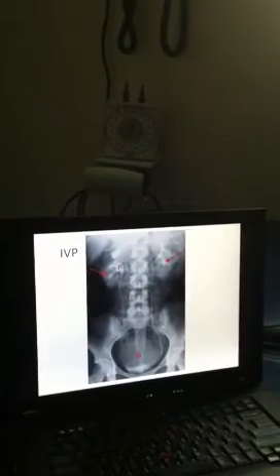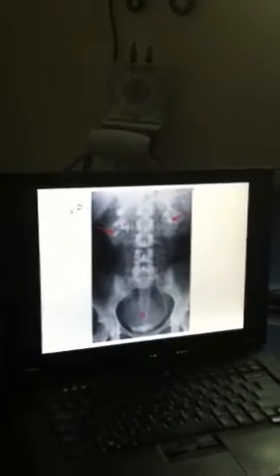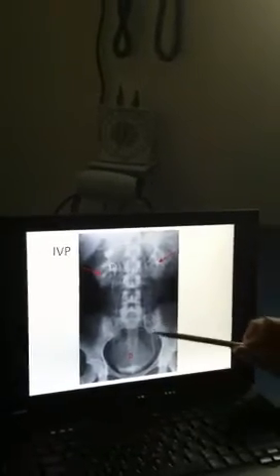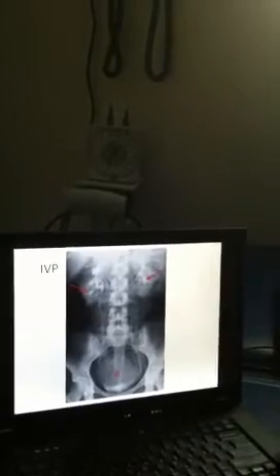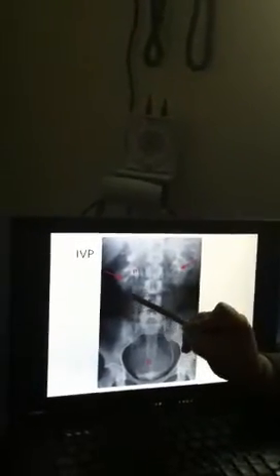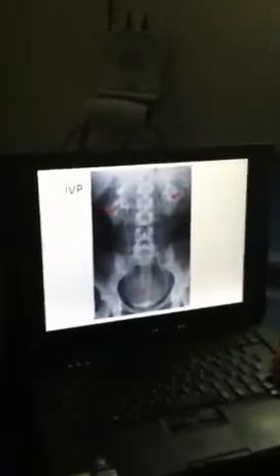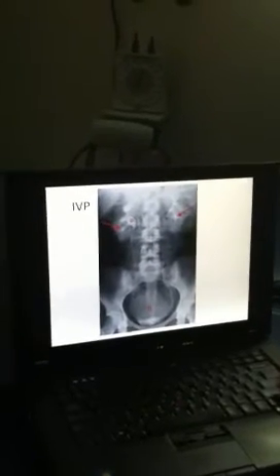They used to use it to diagnose stones, but now it's just easier to see on CT. Plus, you don't have to give the patient dye. Don't forget, you can still see parts of the pelvis, so if you were to use an image like this, all this is fair game. And same thing with the lumbar. And you can see some air in the colon here, but not that well, so don't worry about that too much. What does IVP stand for? Intravenous pyelogram.